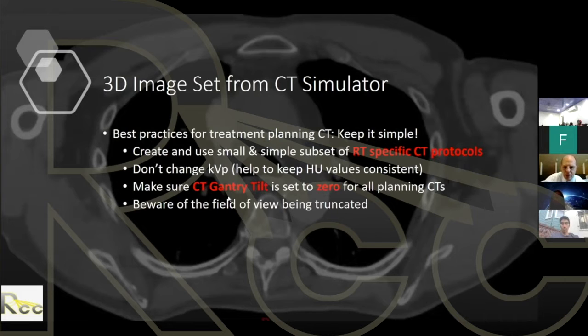Make sure that the gantry tilt is set to 0 for all planning CTs. A lot of CTs have the ability to tilt the gantry, but that's really not something that we use in radiation oncology, and it can confound the geometry of the image set. So we will keep that at 0 for all of our planning CTs and make sure it's 0 when we take it.